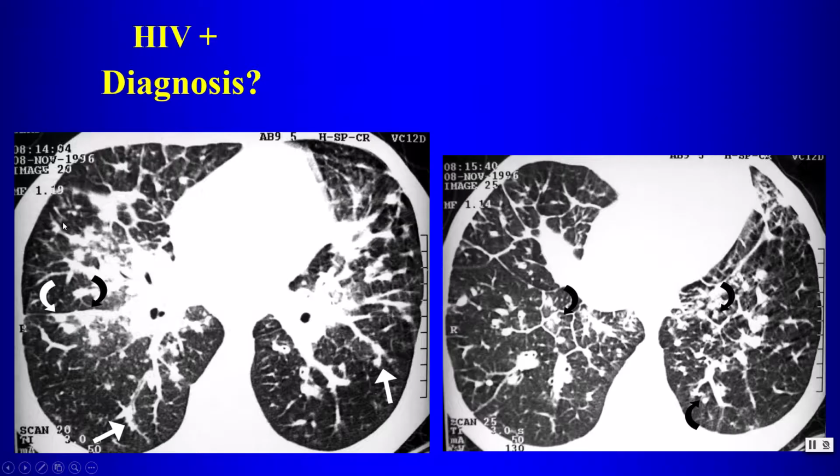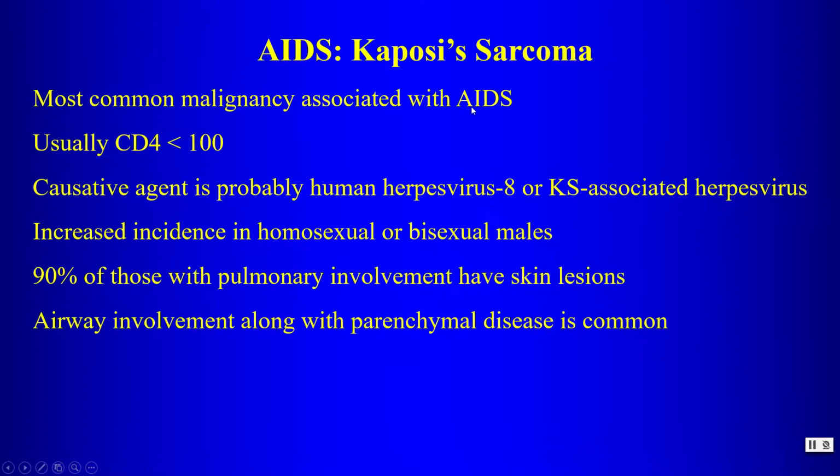and they might have sometimes lesions that also resemble Kaposi's. So here's another case, and this patient has this interlobular septal thickening, but in addition to that has these kind of irregular nodules, especially nodules that seem to be forming around the perihilar vessels and airways. So this peribronchial vascular distribution of abnormalities, well, this is Kaposi's sarcoma.